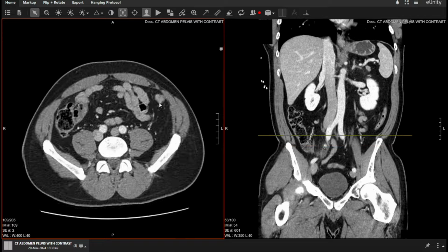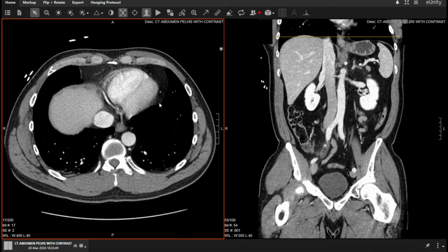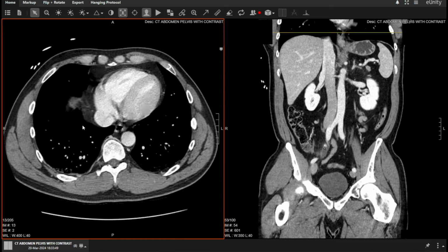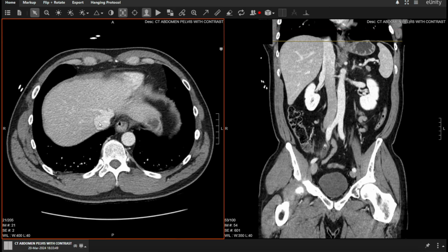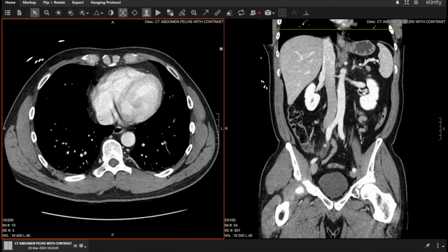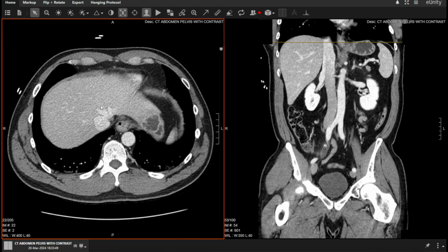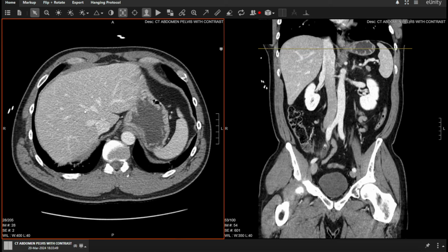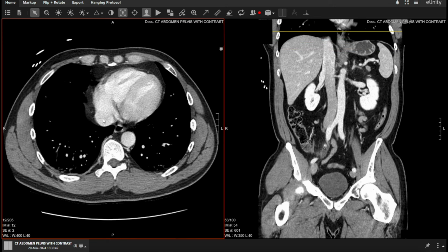All right, now let's look at the major venous structures, going all the way back up to the top. I mentioned before, we know this is the right ventricle. That makes this the right atrium. There's a huge vessel that dumps right here into the right atrium. That's the inferior vena cava, leaving the liver, traveling cephalad, and dumping into the right atrium. We can follow that back down to the liver. You'll see some vessels that are branching in, the hepatic veins. 1, 2, 3, that are dumping the venous drainage back here into the IVC before returning to the heart.